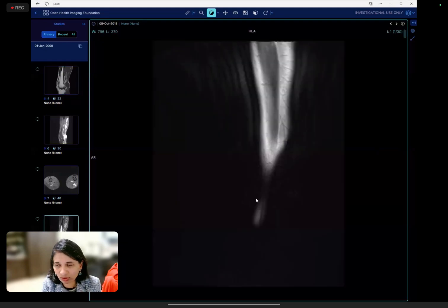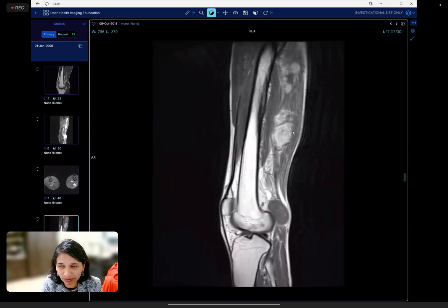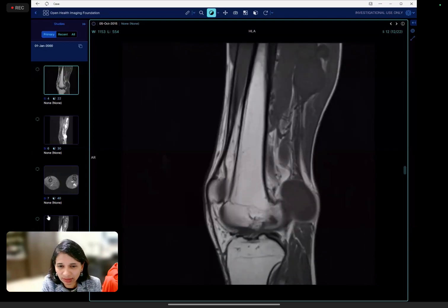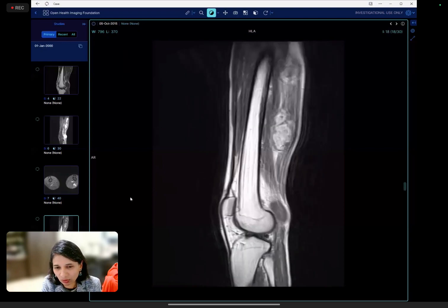And then you asked for the post contrast. Yes, they will have heterogeneous enhancement, but they can be avidly enhancing lesions, which is what we showed here. Because look at the T1 here, and then look at the T1 post contrast here. So avid enhancement. So good.